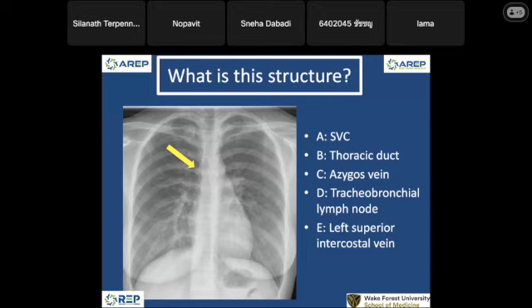If you put things together, we always have the problem with the PICC placement. So when I say that it is in the venous structure, right? The lymph node is something outside the vein. It's in the soft tissue. So what else can be here? SVC. Superior vena cava. Okay.